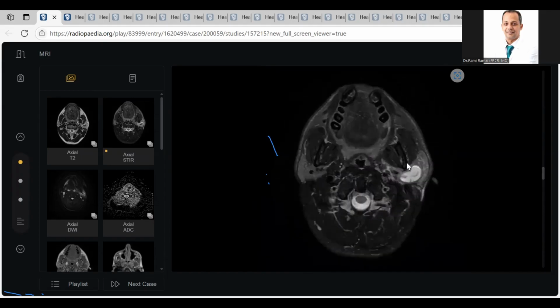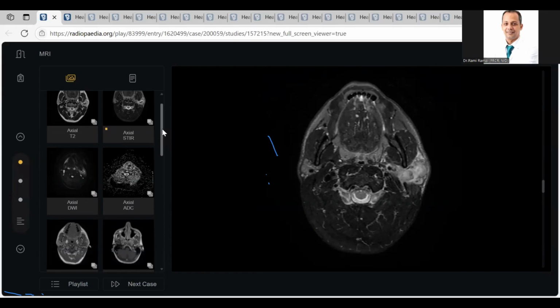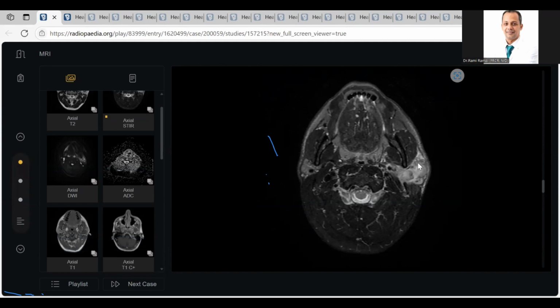Okay, you are right, but look again. The edema is ill-defined, because some examiners are tough and they will not give you a contrast. So you should keep some keys in your brain. This is ill-defined. And the second, I can see here the anatomy is still a little bit preserved. So it looks like non-tumoral. At least you build up an idea about the nature of your pathology.